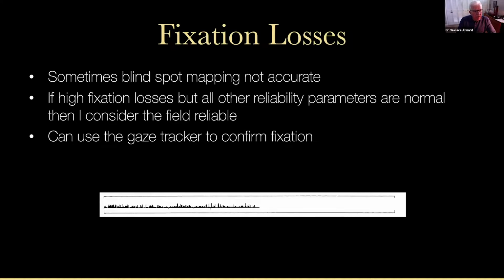And so if you have high fixation losses, but everything else is normal, I usually consider the field to be reliable. And you can use the gaze tracker, which is part of the newer, not that new, but newer software, to confirm fixation.